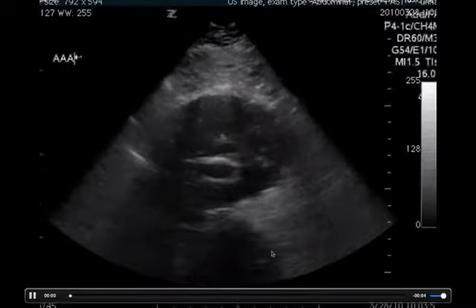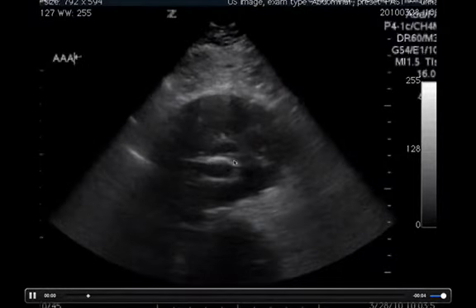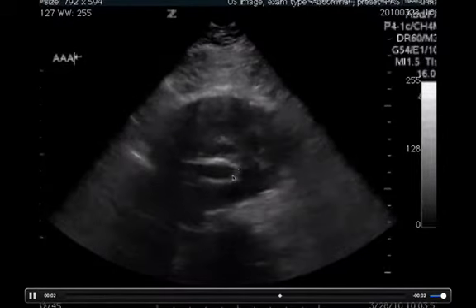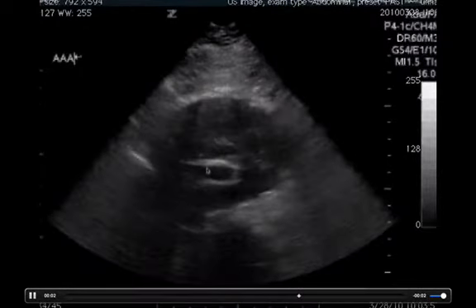This is an example of a guy who survived his aneurysm, because this is an endovascular graft here. So all of this is aortic aneurysm, but this is the functional part of his aorta right here.